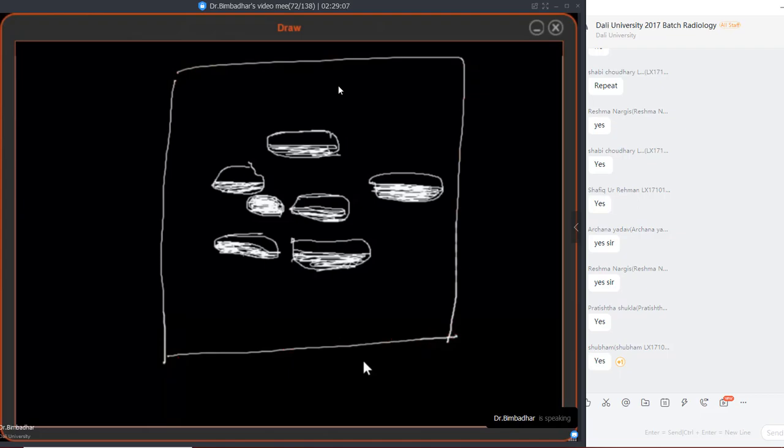Your X-ray will look something like this. A hyperdense area down below causing a fluid level, and then a hypodense or radiolucent area above is telling you that you are looking at a bowel loop. This is fluid, and this is air. So there are multiple air fluid levels at different steps.